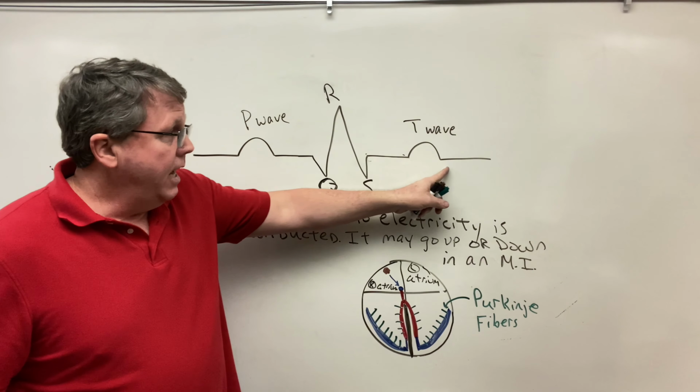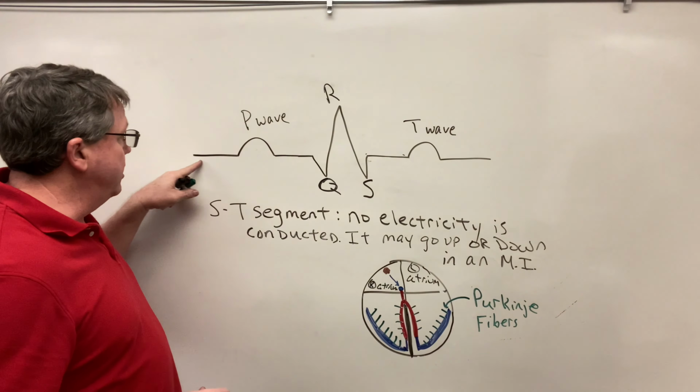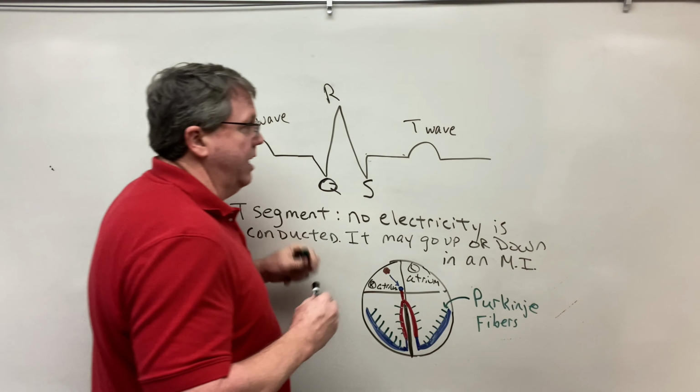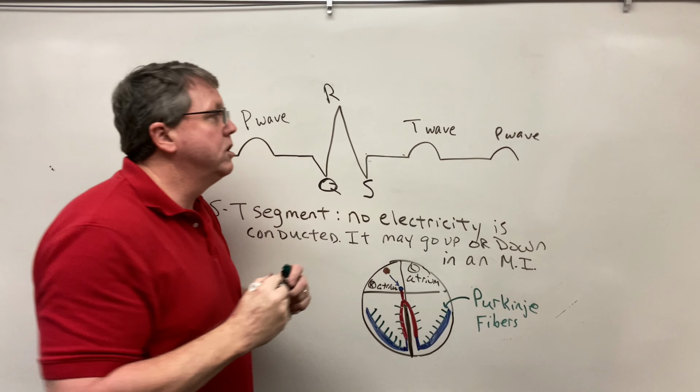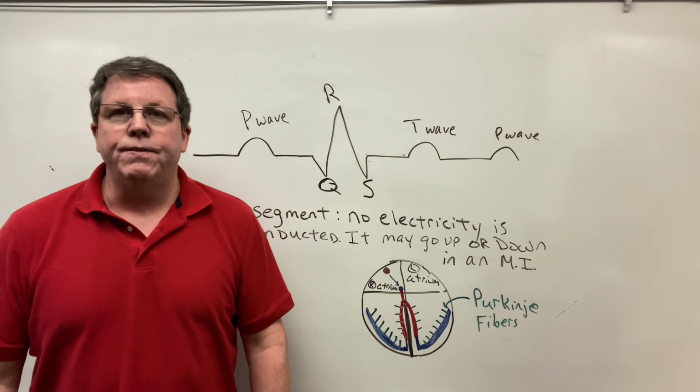Over here, this is basically going to be a continuation going on to here. So what I could actually do here is then draw my P wave again. Okay? So, that's reading the EKG, and thank you so much for watching.